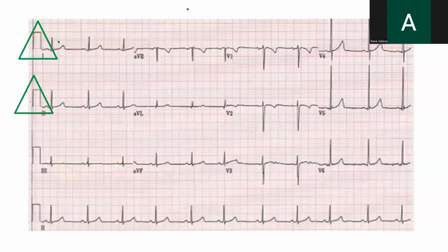Now look at technical settings. First of all, the calibration. As mentioned on the screen, calibration shows us whether an ECG machine is set correctly. So calibration is often upright, guys.